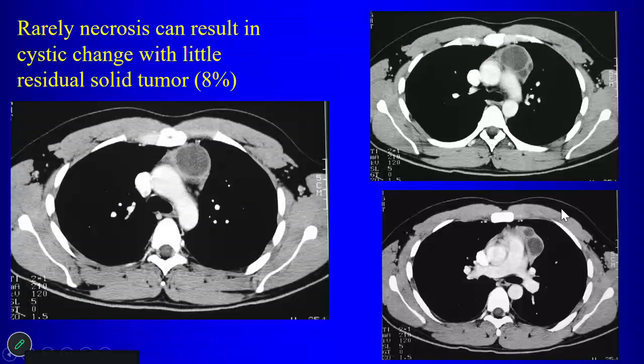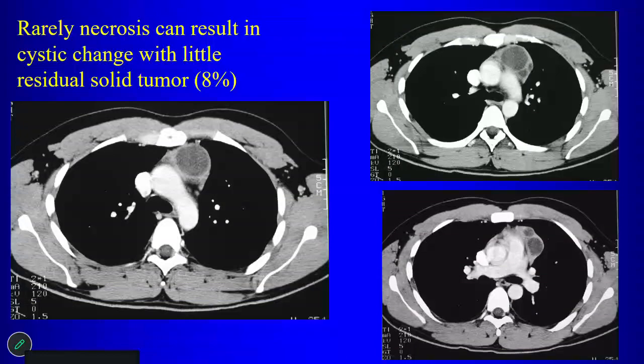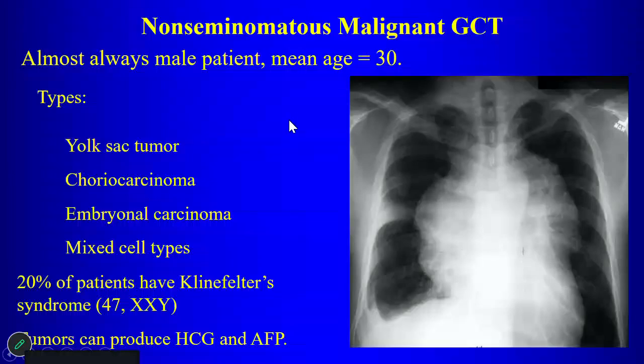Sometimes these can be cystic. So if you have a multiloculated cystic tumor, enhancement, thickening of walls, that can be a cystic variety of these seminomas. We should also consider TB lymph nodes. For TB, that would also enter your differential diagnosis if it looked like lymph nodes, right? But these don't really look like lymph nodes, right? But if they look like lymph nodes with peripheral enhancement, low attenuation centers, then of course you're going to be thinking about tuberculosis.